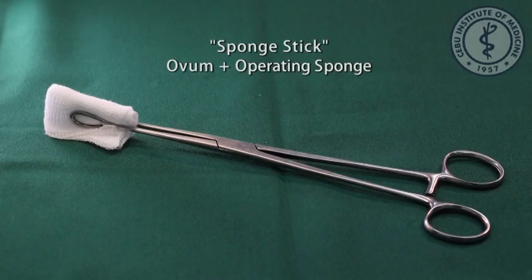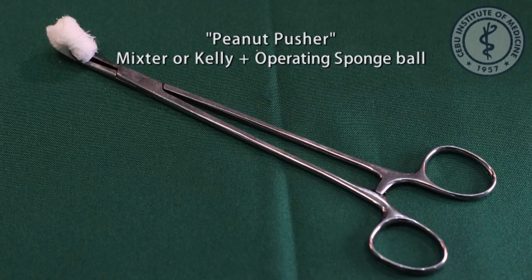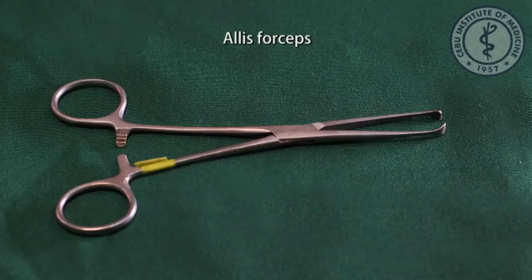Ovum forceps, sponge stick: ovum forceps plus operating sponge, for blunt evacuation of blood clots such as in exploration. Mixter forceps, peanut pusher: Mixter or Kelly forceps plus operating sponge ball, for blunt dissection. Babcock forceps, for grasping hollow or visceral tissue. Allis forceps, for grasping connective tissue.